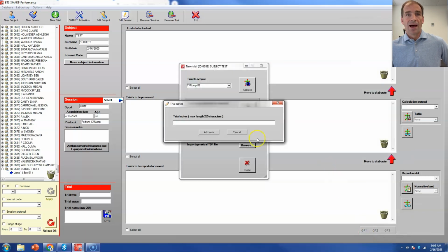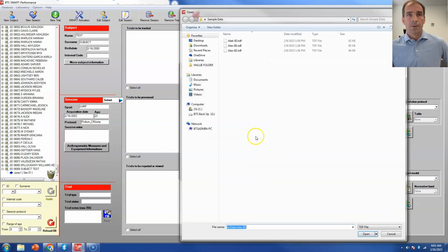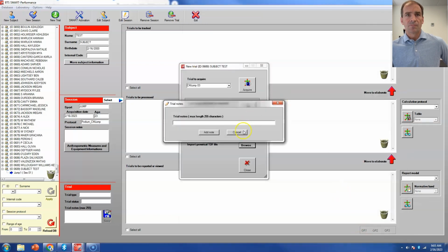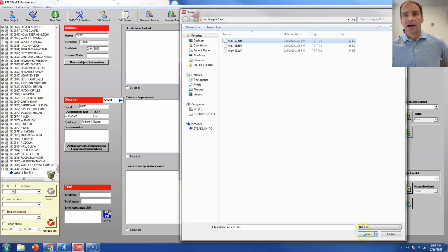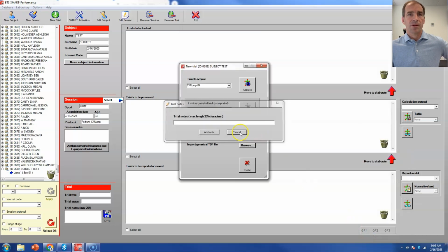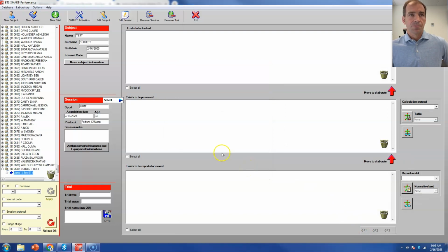We'll upload that. It's going to ask me if I want to add any notes to it. I don't, so hit cancel. I'll go to my second one, and I can keep doing this over and over again. I won't add any notes to that. I'll go to my third one. And again, however many jumps you have, you put them in there, that's fine. I just have 3 jumps, so I'm done with uploading. I'm going to hit close.